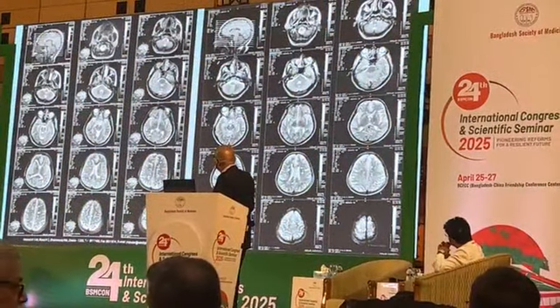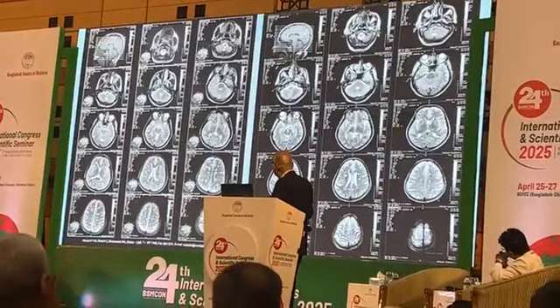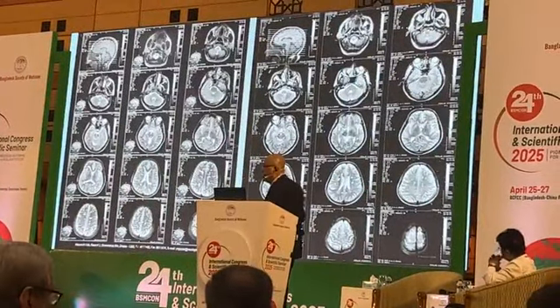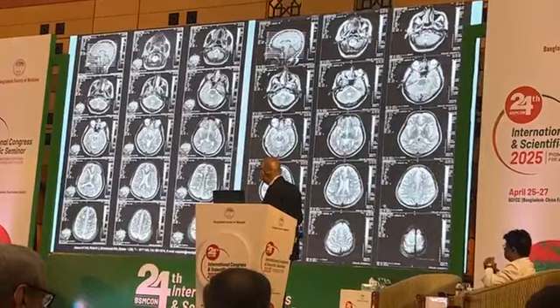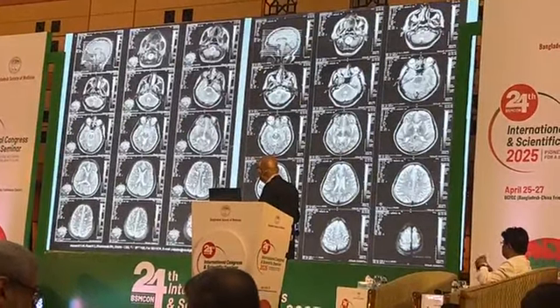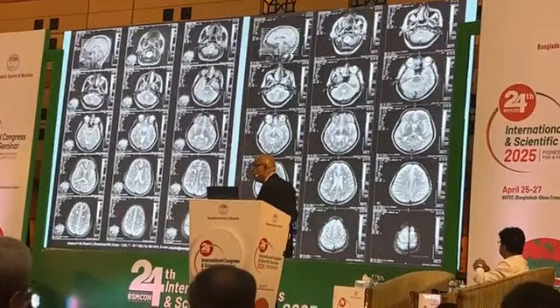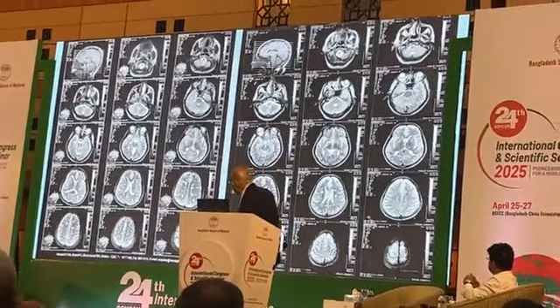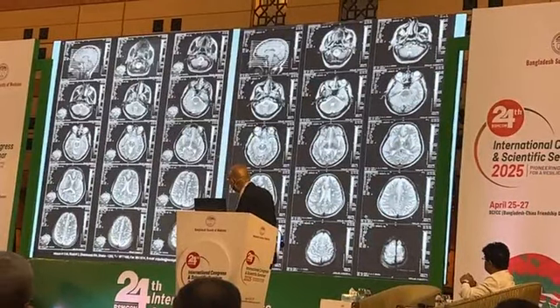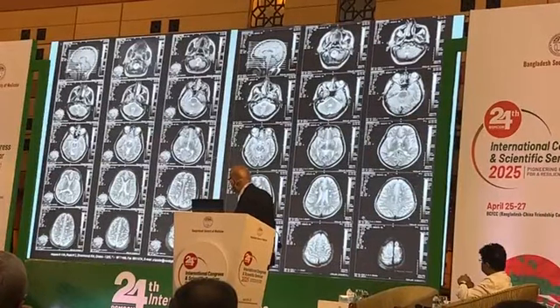Right. You can see in both situations there are multiple small T2-weighted white lesions. These are exclusively situated in the white matter, mostly in a periventricular situation, right? But can you see in this one, oval, perpendicular to the lateral ventricular wall and closer to the ventricles.